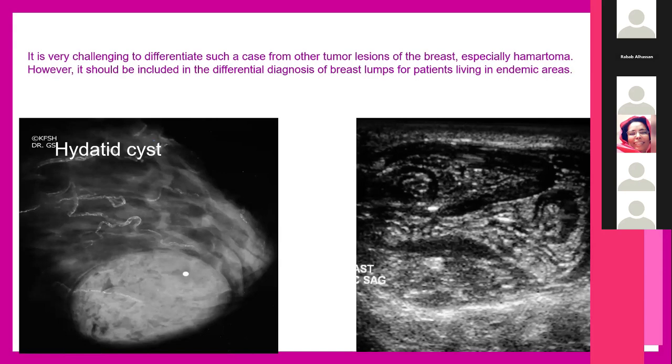The interest here, it was a hydatid cyst. It is very challenging to differentiate such a case from other tumor lesions of the breast, especially hamartoma. However, it should be included in our differential diagnosis of breast lump for patients living in endemic areas.